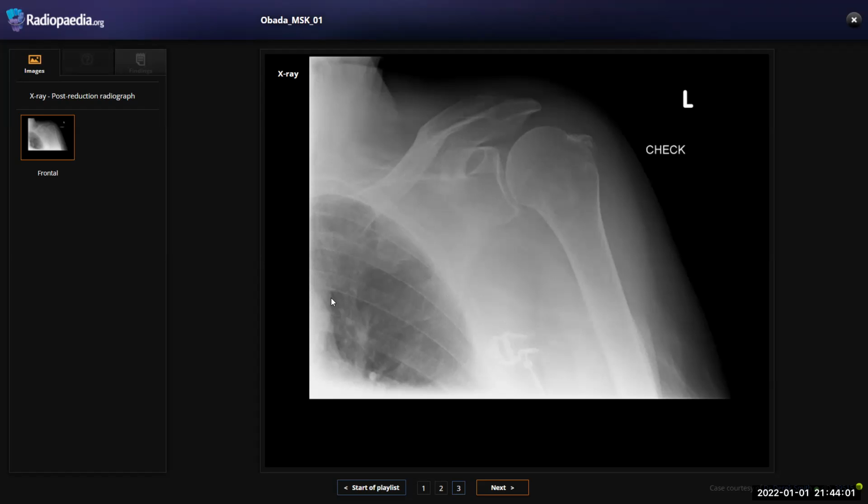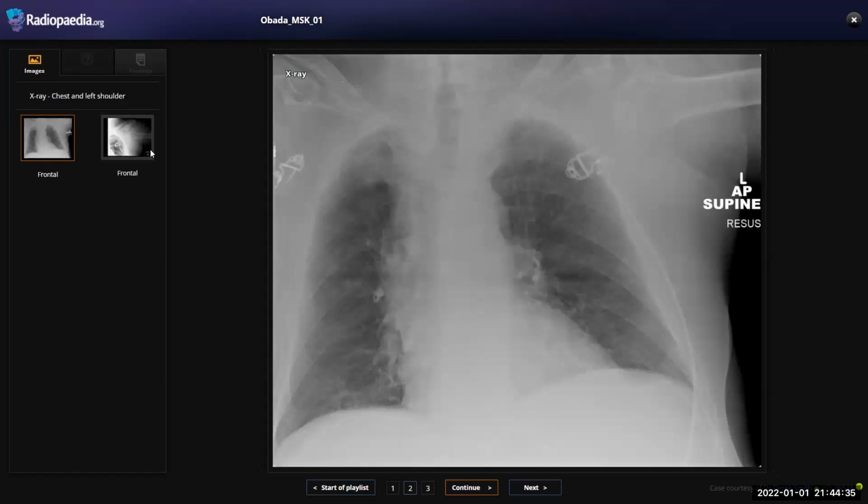Okay, so you said this is anterior inferior dislocation. Yes. Can you tell me what the types of the shoulder dislocation are? The most common type is anteroinferior dislocation, but in some cases, patients also develop posterior dislocation, in cases of electrocution or any post-ictus cases. Yes.